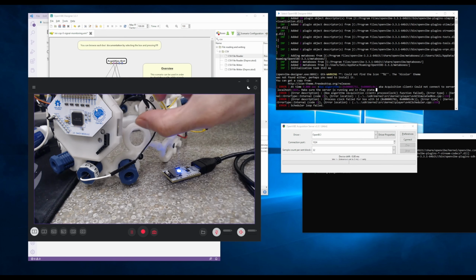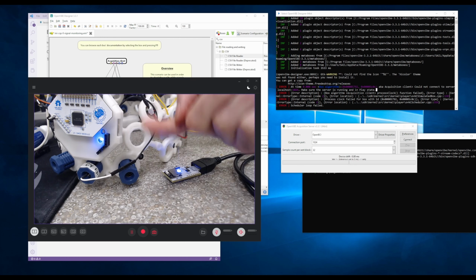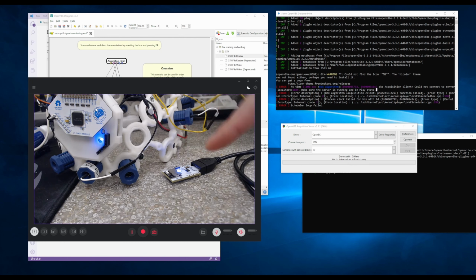And if it's plugged in, you can just switch this up. Up is for the radio module, which is this. And down is for Bluetooth, but I'm not even sure if it works. So it's on.